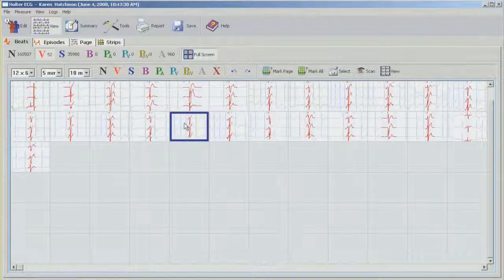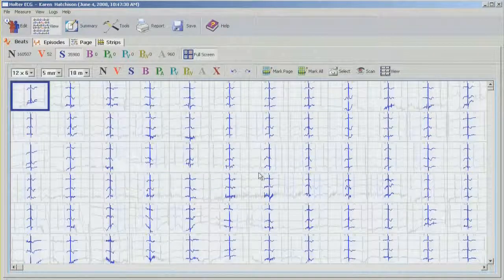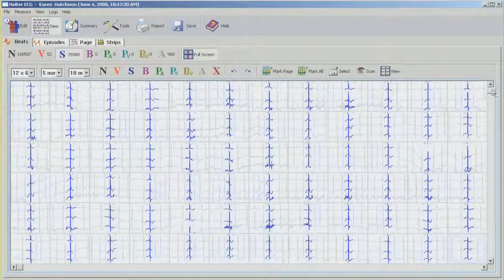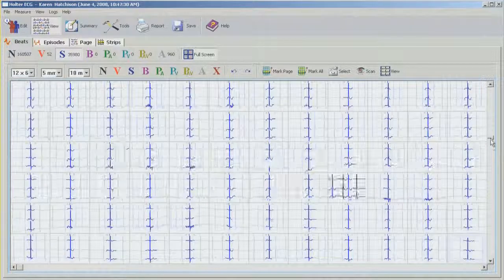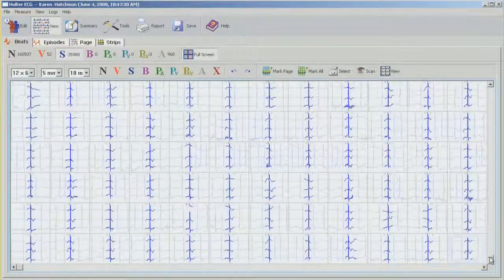So again, going back to the bins, and we've pretty much finished editing all the ventricular beats. We're going to move into the supraventricular bins. Now, since this is AFib, obviously none of these are correct, or all of them are correct, but I'm just going to quickly scroll through those just to make sure there's no VPBs hiding in here. It's going to be a long process with 35,000 beats, so I'm just going to quickly drag this down. All these should be labeled correctly, but I just want to make sure there's nothing missing in here. So I'm happy with this bin.